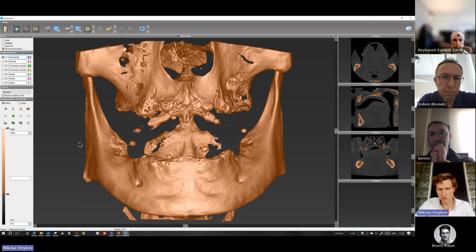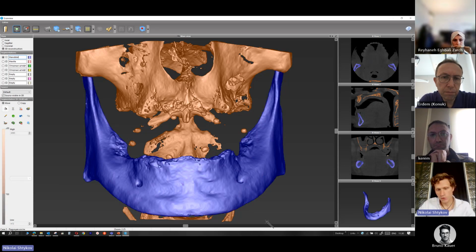I think that this one is okay. Now I push the button for this and color this.